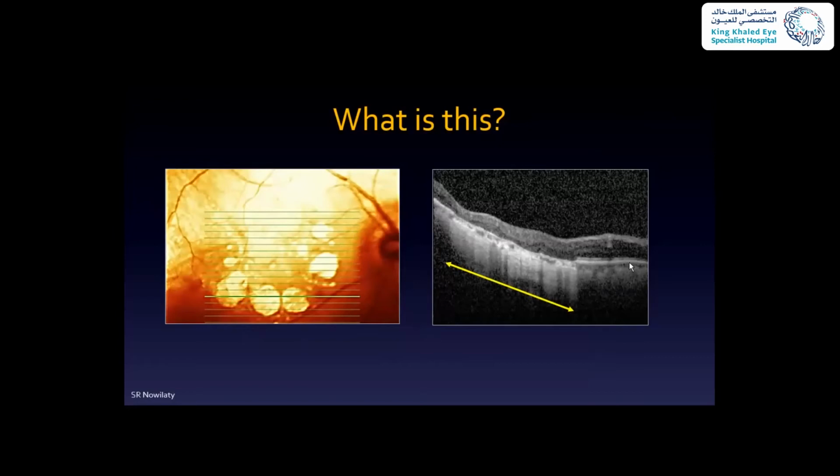A lot of posterior shadowing. You can see the RPE layer, you can see the ellipsoid zone, and then basically this is all lost, and you have tremendous inverse shadowing behind it, and that's because you are going through a series of, somebody answer, chorioretinal atrophy. Yeah, exactly. This is chorioretinal atrophy, and the reason there was chorioretinal atrophy is because there were big laser scars. Okay, so big laser scars here caused this inverse shadowing.